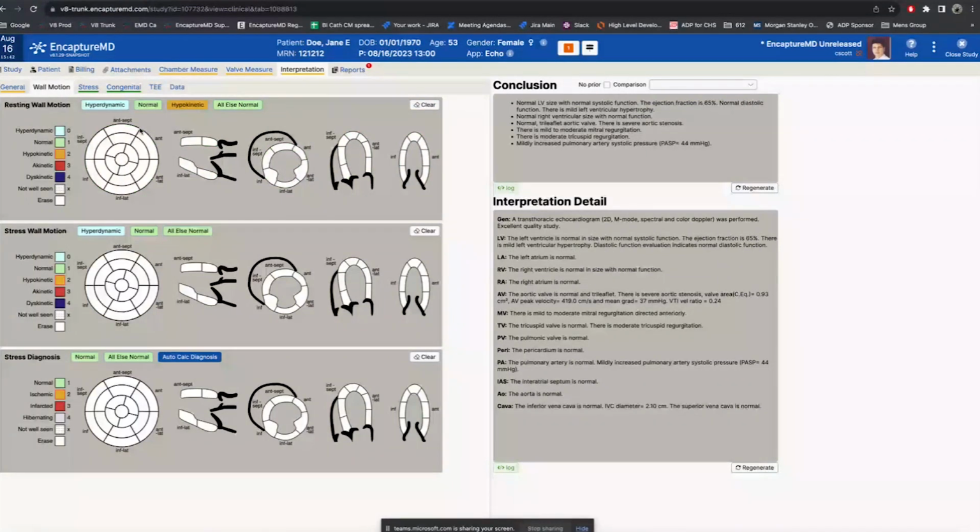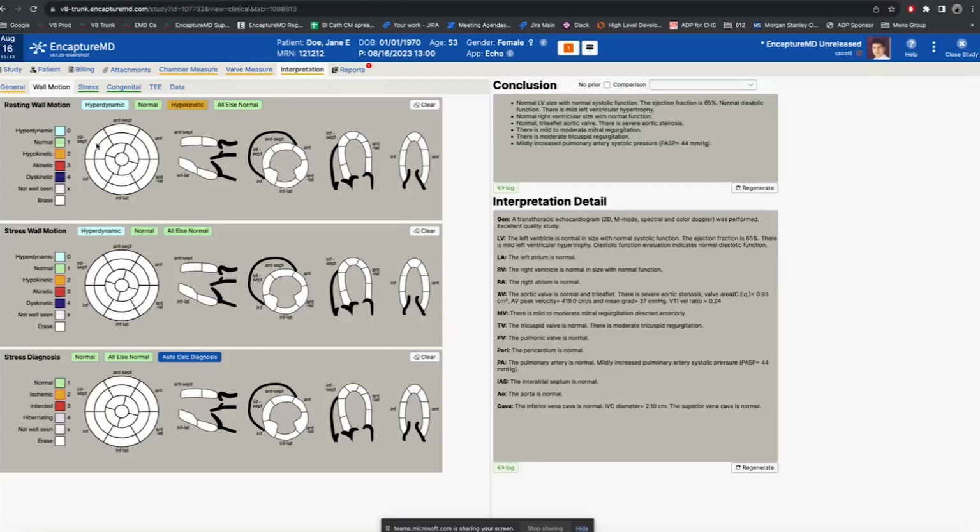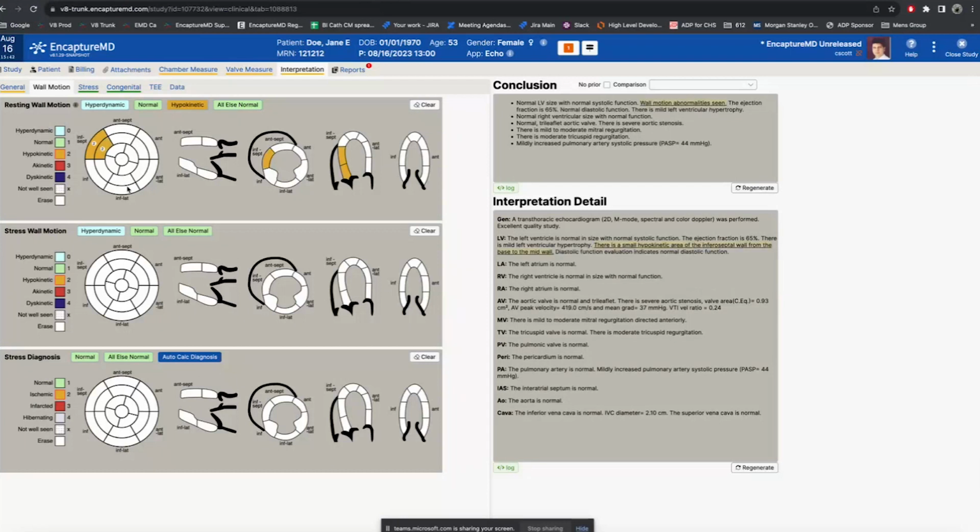So this is in patients with cardiomyopathies where there's nothing regionally wrong. The septum of the heart and the lateral wall of the heart are both contracting the same, but just not well. So in that case, I can call it hypokinetic, and then it doesn't make sense with the way I've got my ejection fraction, but that's fine. And then the third thing is I can say there's hypokinesis, but it's only in some part of the heart, and then say the rest of the heart is normal.